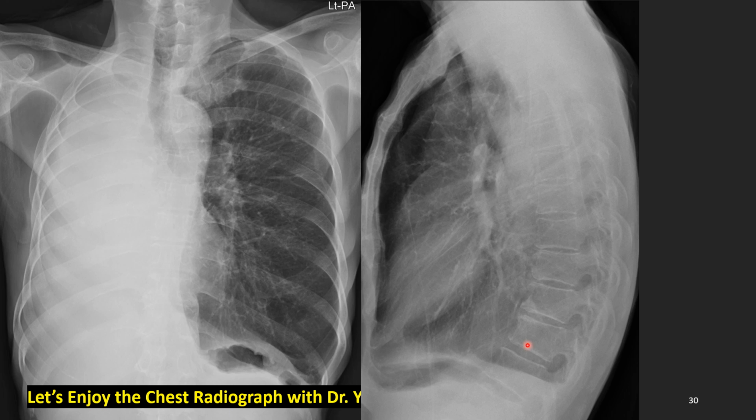This lateral film is interesting. Total haziness, except anterior side. This may be due to the herniation of the left lung to the right side. And only one hemidiaphragm visible. Right one is gone. No hilar structure, no pulmonary vessel. Yes, this is a right lung total collapse.